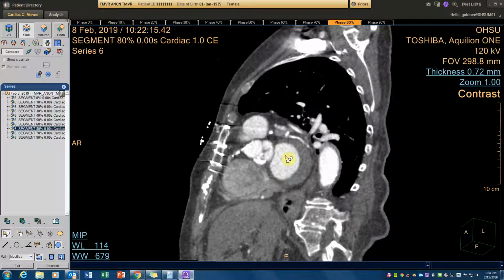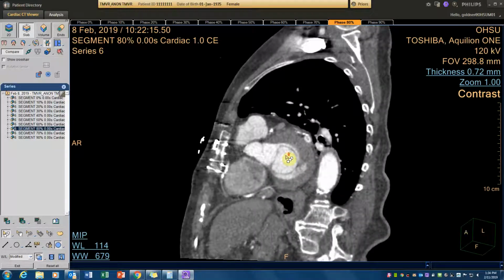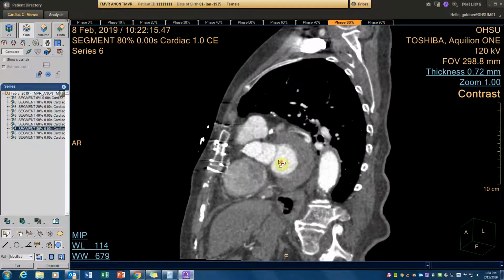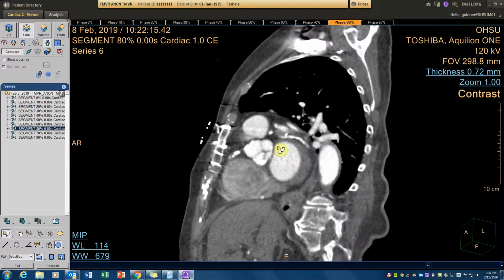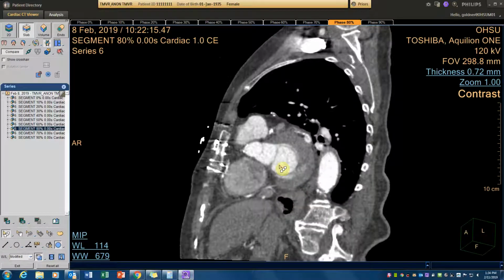But if you go too far deep like this, it's still relatively D-shaped, but you're actually going to be in the left atrium. And it can be tricky because you can see that the tissues here look pretty similar to the mitral annular ring. So I think somewhere between this slice and this slice is going to be where to go. Probably use this one. And again, so here's the contour of the mitral annulus that you want to follow.